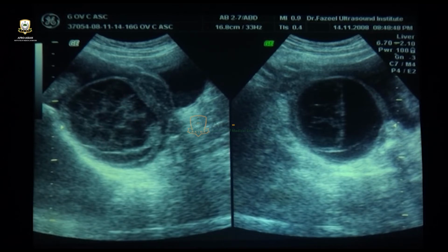Yes, this seems confusing, but actually it was hemorrhagic ovarian cyst with some leakage of the blood there. Sometimes these cases present with serious emergencies. The hemorrhagic cyst is a great mimicker. The dermoid cyst is also a mimicker. And the ectopic pregnancy has fooled many senior sonologists and gynecologists.